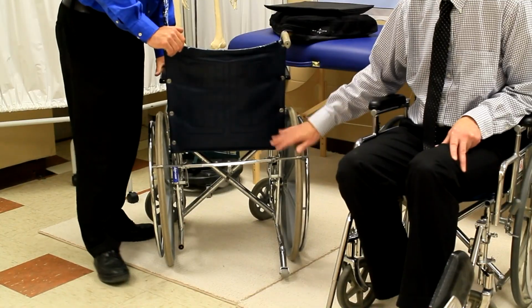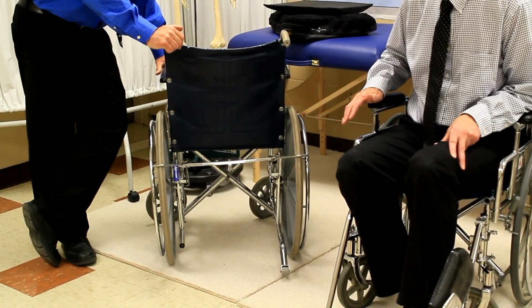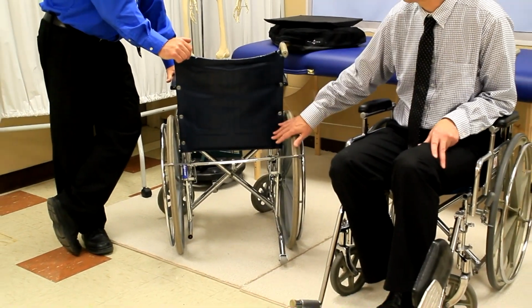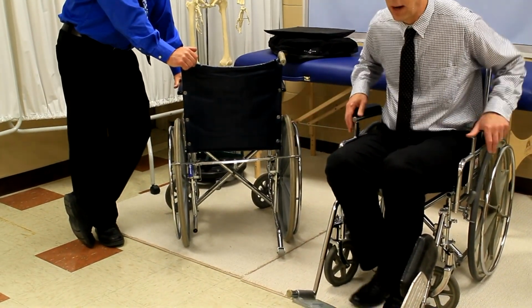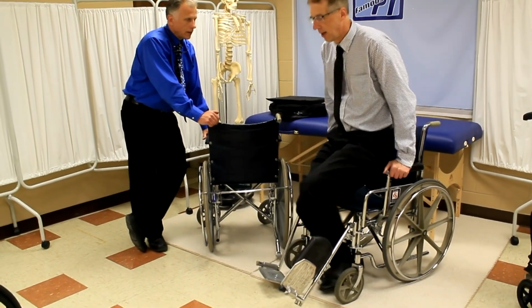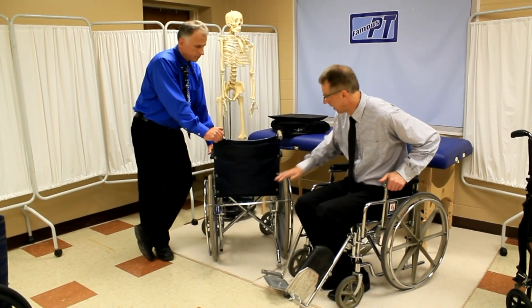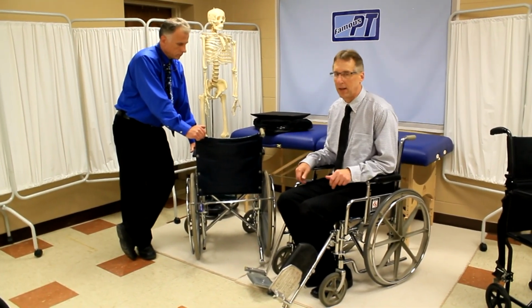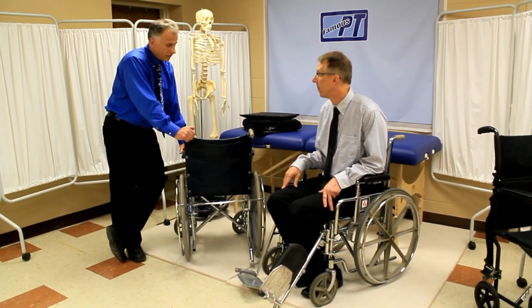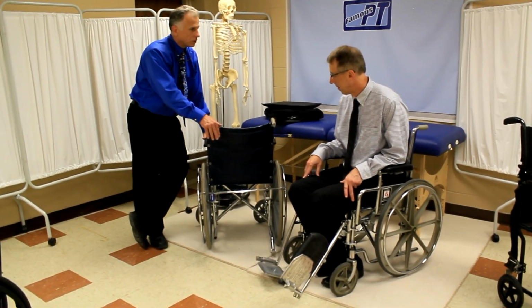This is for the person that maybe forgets to lock their brakes before they get up out of a chair. Right. We have a lot of people that are like that, and obviously when they try to get out of a chair, they might fall. Right. So as soon as they take their butt off the seat pan, it locks. Yeah. And it works really well. It's a nice safety feature for people who are forgetful or confused, whatever. A lot of times it's in the nursing home that they have these.